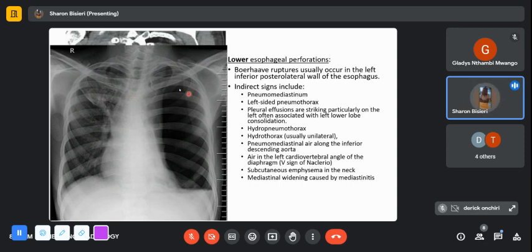In this frontal radiograph, AP, we can see there's an obvious fluid level in the left hemithorax, and there's complete lucency of the entire left lung field, and you can see a mediastinal shift to the contralateral side. So this is also indicative of rupture of the esophagus with fluid and air occupying that lung field.